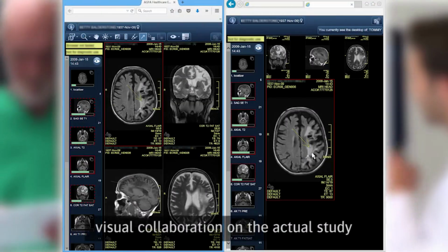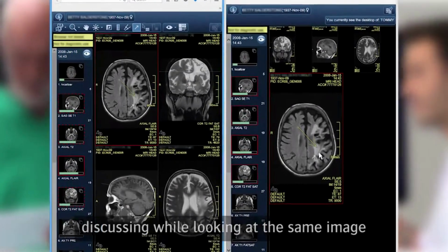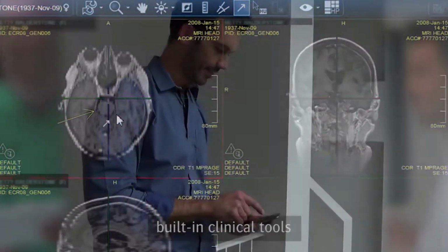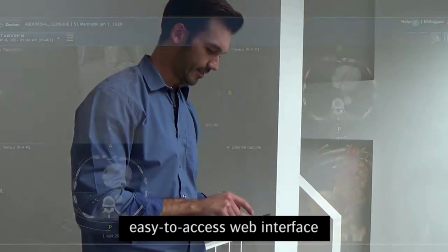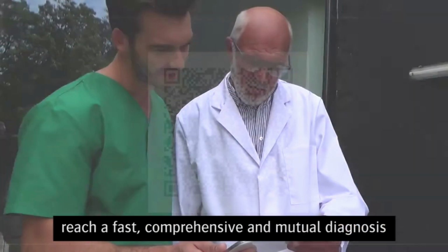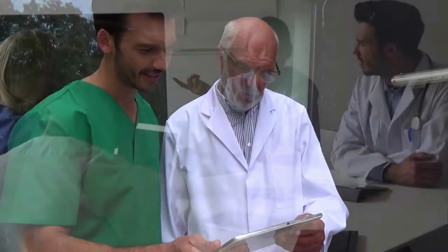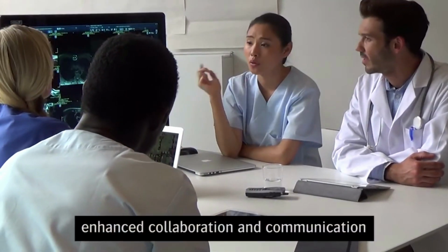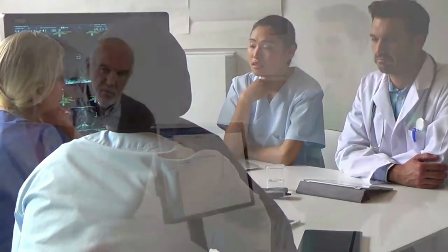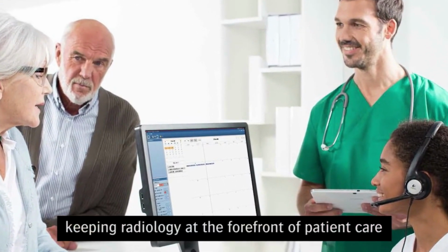How about visual collaboration on the actual study? Discussing it with your colleague while looking at the same image? Using the built-in clinical tools while you both see in real time what you are doing? The easy-to-access web interface even lets you share data from a mobile device. Reaching a fast, comprehensive, and mutual diagnosis has never been so straightforward. With enhanced collaboration and communication, AGFA Healthcare's Enterprise Imaging for Radiology allows your work to be seen and valued, keeping it at the forefront of patient care.